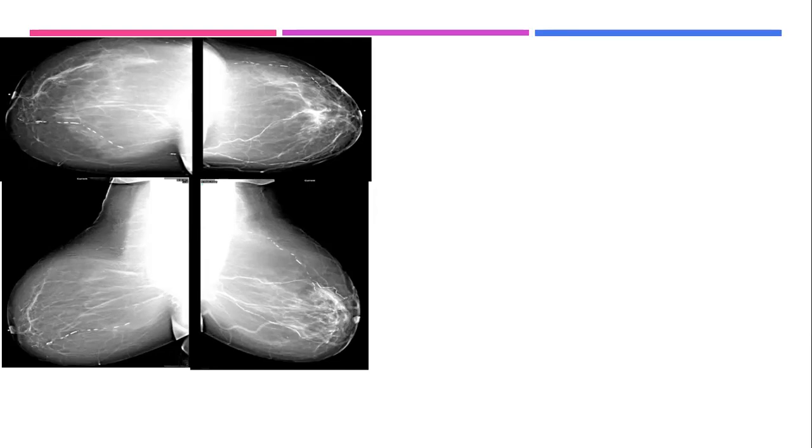So what is next? Yeah, to do ultrasound. This lady had had mammography and ultrasound done 2 or 3 times, reported as negative, and they sent the patient, apart from the ulcer, to the dermatologist.